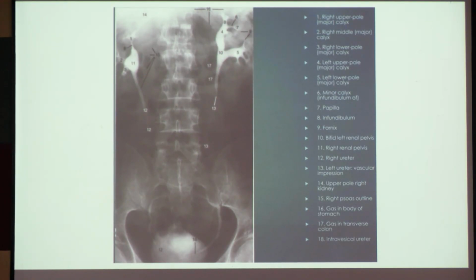So these are the bowel shadows, and many a times if we do not have a very good bowel preparation, we are going to miss out on many of the important findings. Small stones, which are radiopaque shadows seen within the X-rays, can actually get obscured because of these bowel shadows coming in between. So these bowel shadows need to be understood. This psoas muscle, there is a faint outline which we can also see from the kidneys.